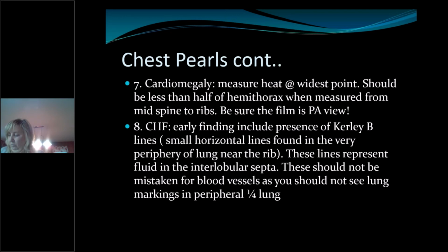And again, this is another tool to help validate or refute. If you go in there and they've got plus 4 pitting edema, they're short of breath when they lay down and better when they're sitting up, and they're wheezing like a freight train, I think it's a pretty safe bet they're CHF. So think about those things when you're looking at this, as opposed to just counting on the chest film alone by itself.